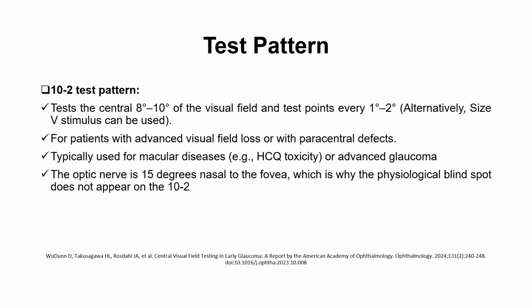However, the 10-2 test pattern can be used for advanced visual field loss or with paracentral defects, and focus on this point, because many ophthalmologists believe that 10-2 test patterns are only used for advanced glaucoma. However, it can sometimes help in detecting the early paracentral defects seen in glaucoma patients, and we'll elaborate more on this point in the following slides. It's typically used for macular diseases like hydroxychloroquine toxicity or advanced glaucoma.